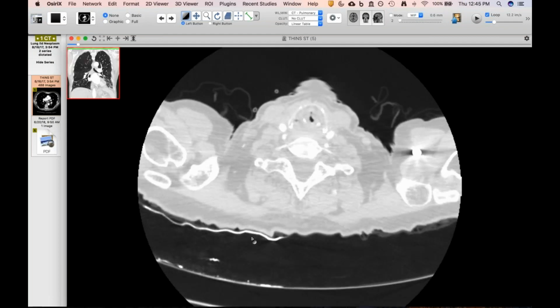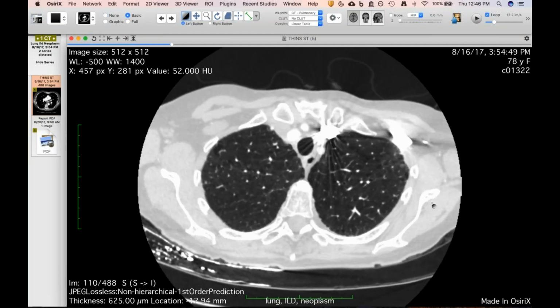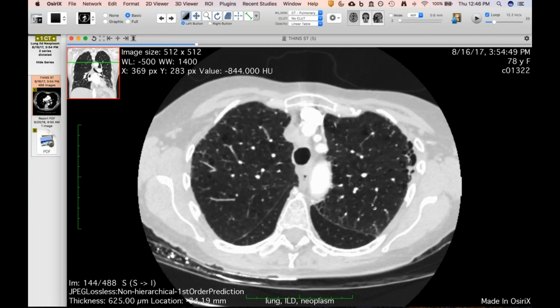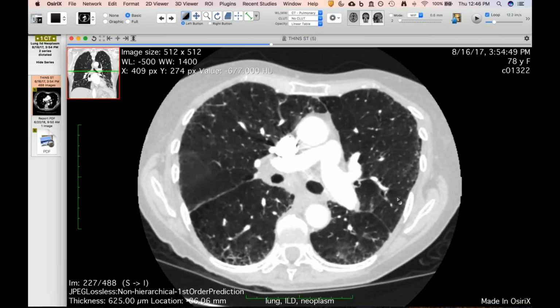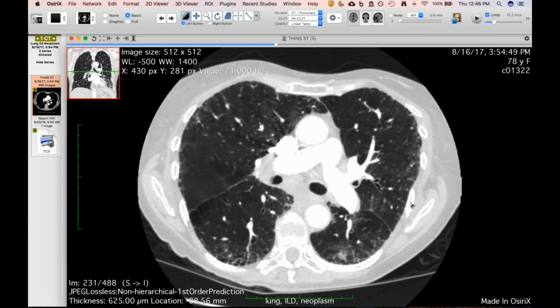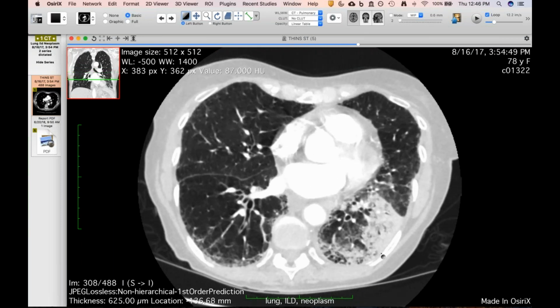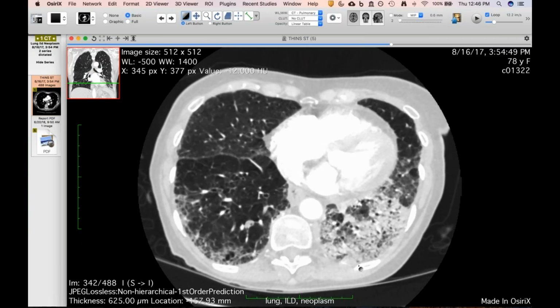So this is a patient referred to our interstitial lung disease clinic, and she's 78 years old. And this is the only CT we had. She has some emphysema, and you can debate whether or not it's honeycombing here, and that won't be the important part though. She had a bronch at the outside hospital, which was negative.